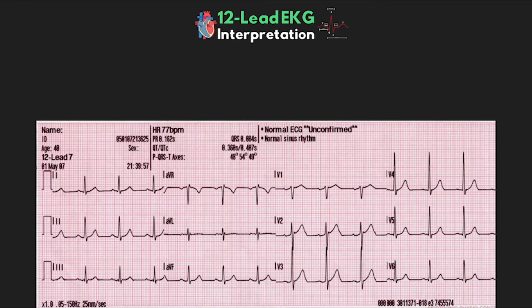All right, so from here, moving on to step 3, what we're going to be looking at here is our ST segment, T-wave abnormalities, and our QT interval. So we want to take a look at a few more areas that really could show us important information on this EKG. So first, we're going to evaluate our patient's ST segment.